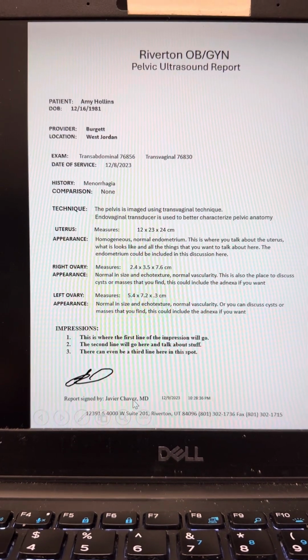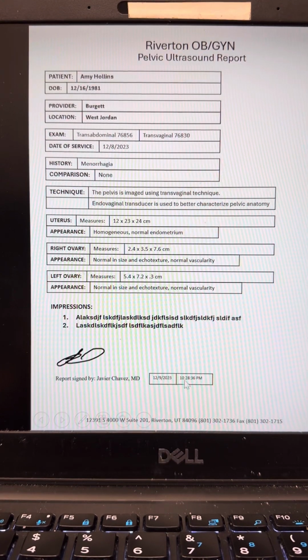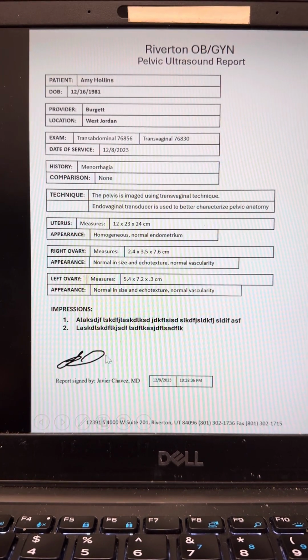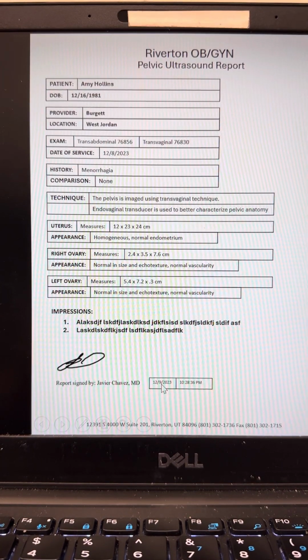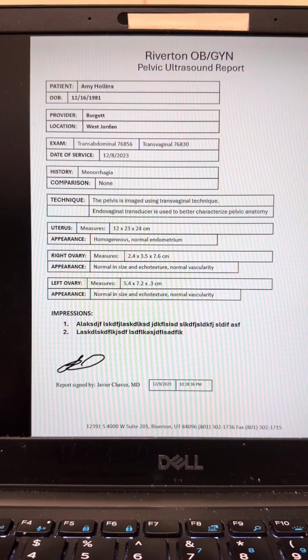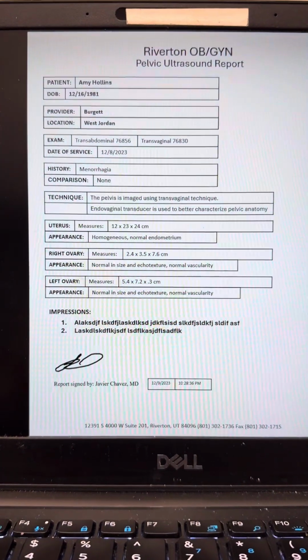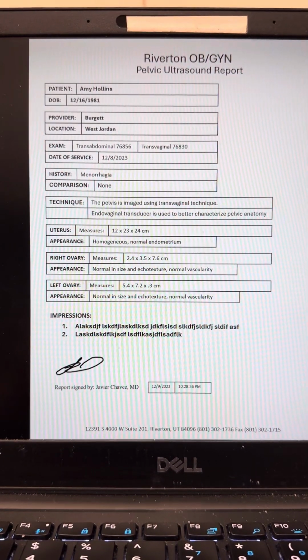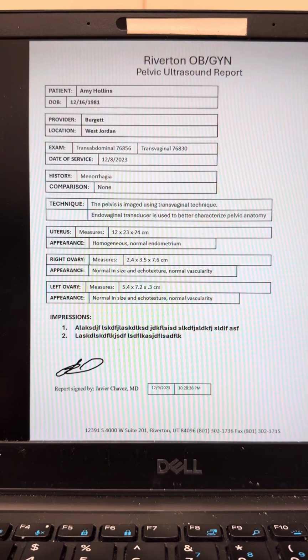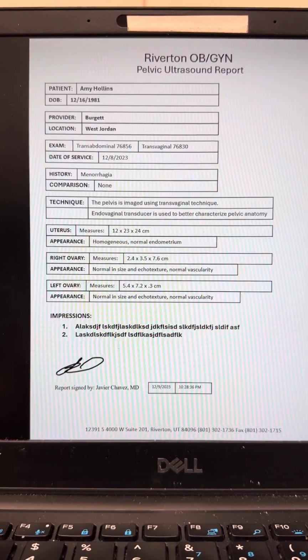So hopefully we'll be able to make something where, going back to the format, you'll type in the impression here, push the tab button, and it'll take you to here, and you'll be able to put a T for today, tab, and then it'll come up with today's date, which is the date that you read it. Then you tab over, and then it will be this time, and you'll put N for now, and it'll put the exact timestamp that you read it. So it looks more complicated than it is going to be. It'll just be tab, T, tab, N, done, right?